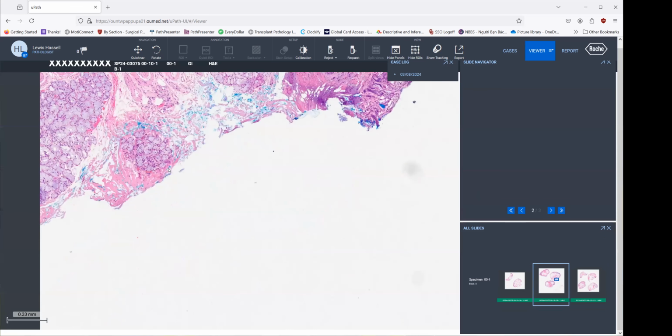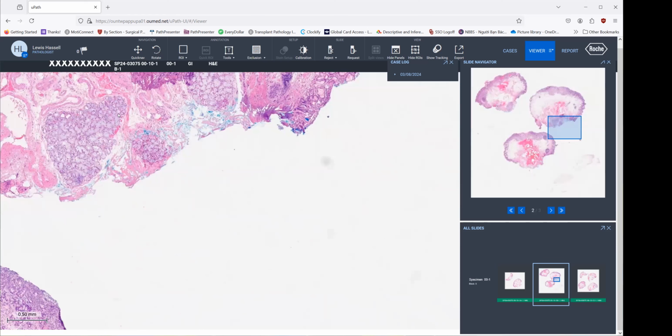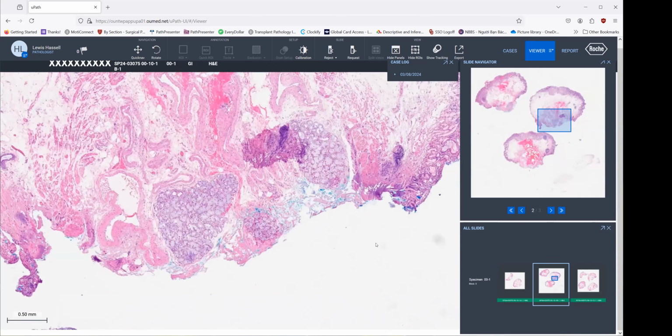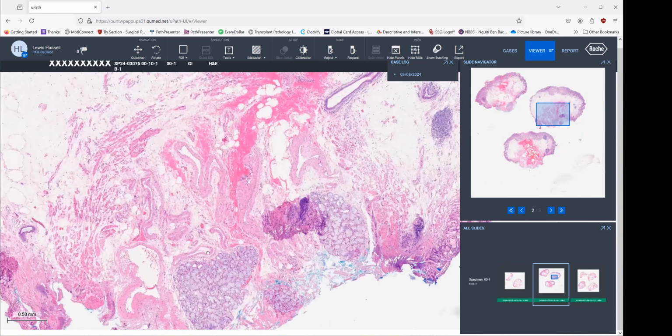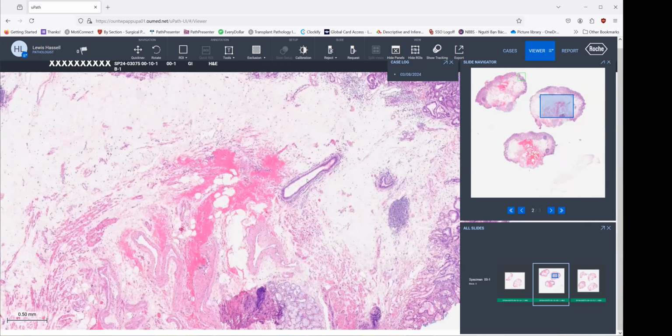Now, again, in these endoscopic mucosal resections, we put ink on the deep margin so that we can determine true margins if there's invasive neoplasia. Here you see these submucosal mucin glands, which are likely the reason for resection. And of course, there will usually be somewhere a duct that is coming to those submucosal glands.